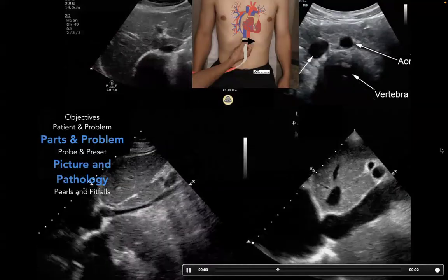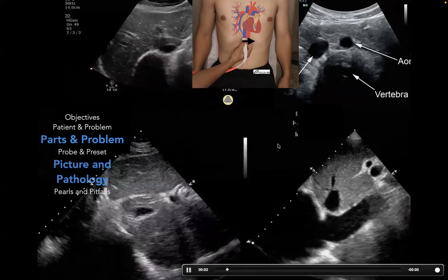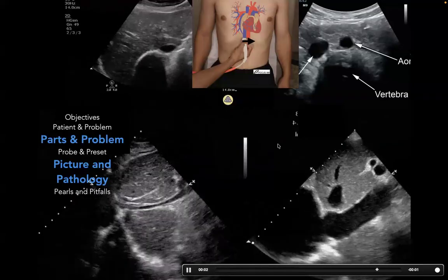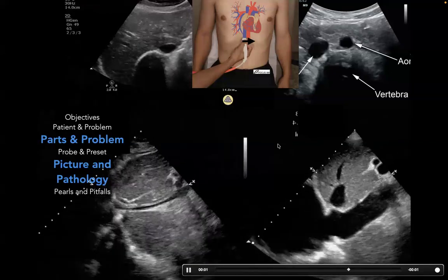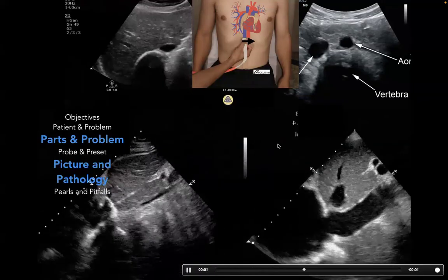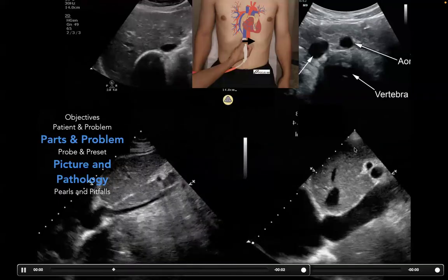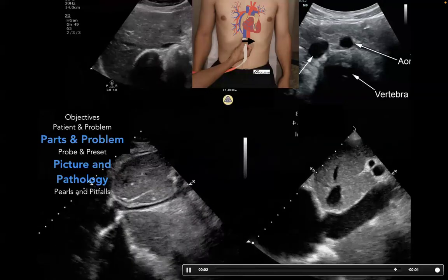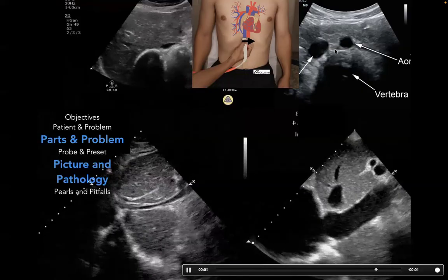Now with IVC, usually I like to use a sports analogy because the IVC, as you know, is a correlate for right atrial pressures. And so it's only really helpful when it's really big or really high or really low. When it's really low, patients are likely volume depleted and they're more volume responsive. So that's the picture to the left. Whereas when someone has higher right atrial pressures, they're likely less volume responsive. And so their IVC is big and not as responsive. And they look like this.